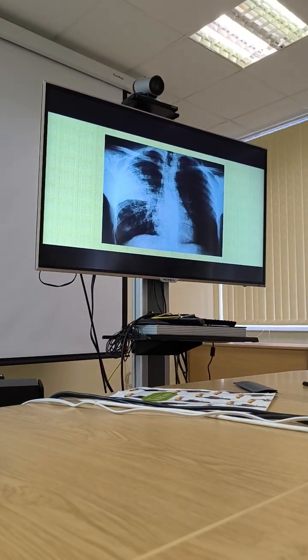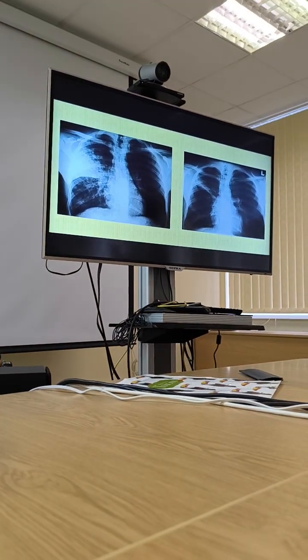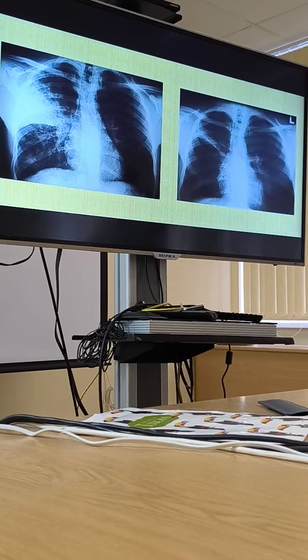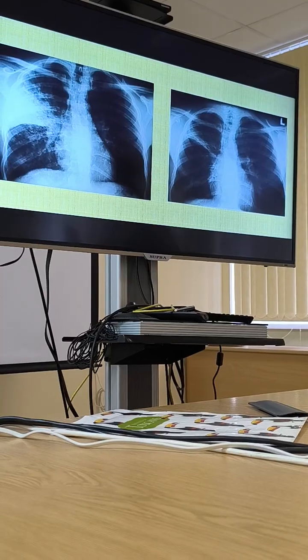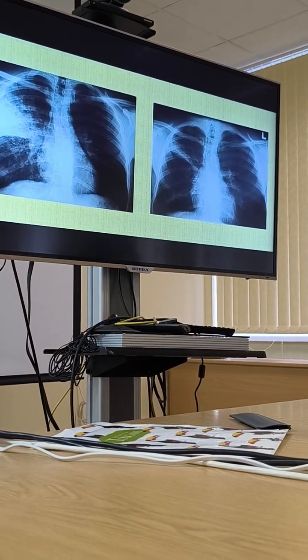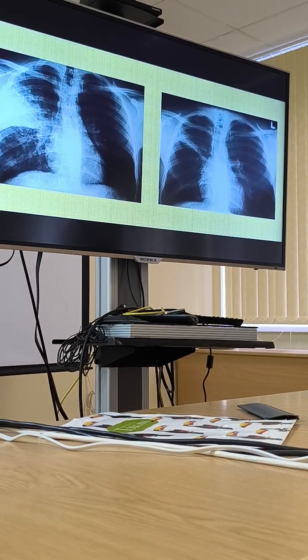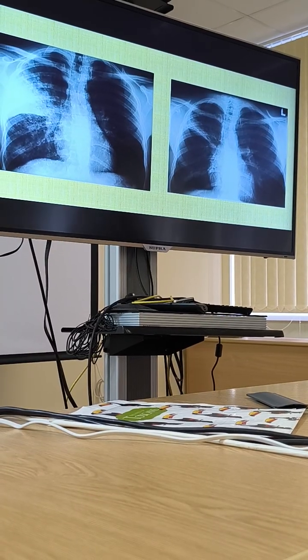And what we can also pay attention to, like this: you see, there was a pneumonia clinically, and we treated this patient with antibiotics, and 2 weeks later we produced another picture. How will you describe this picture? What do you see there? A narrow triangle. If they see something like this, what can they understand? So there was inflammation there, and we treated it, and we were successful, but there is still volume loss, and so that is highly suspicious of atelectasis and central cancer.